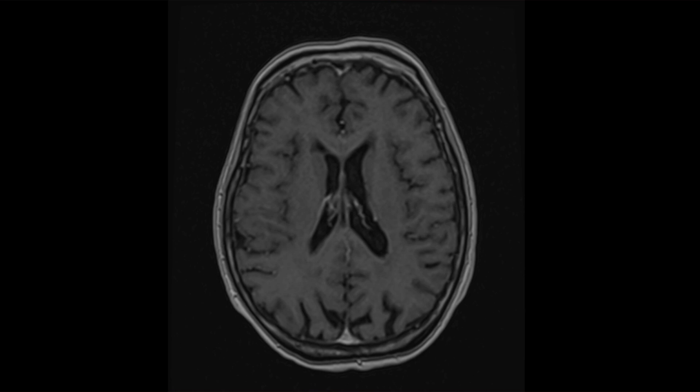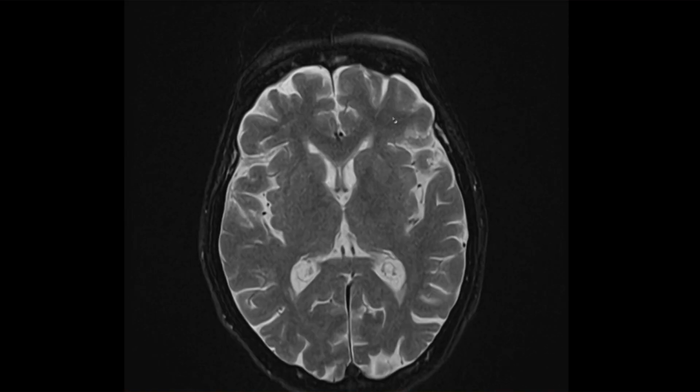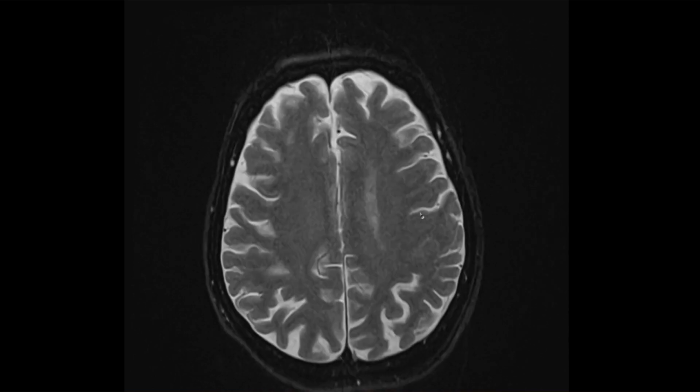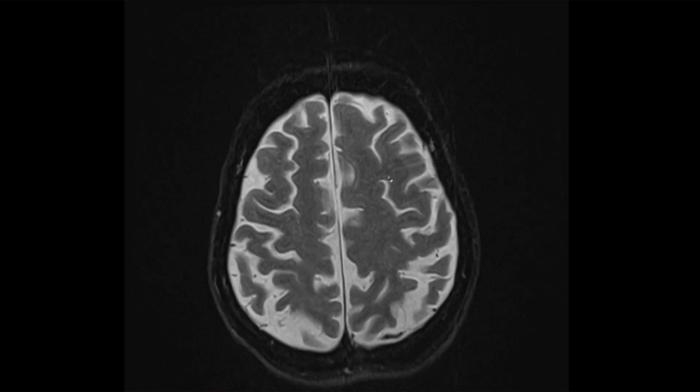Okay. So the next thing we'll talk about, just to kind of make it flow a little nicely, is the T2 sequence. So T2 sequence, this gray-white is reversed. There are only really a couple things that I think I know of to use this T2 sequence for. You could see this fluid signal, which is kind of nice. If there's like a cyst or something, you can sort of troubleshoot that with the T2.